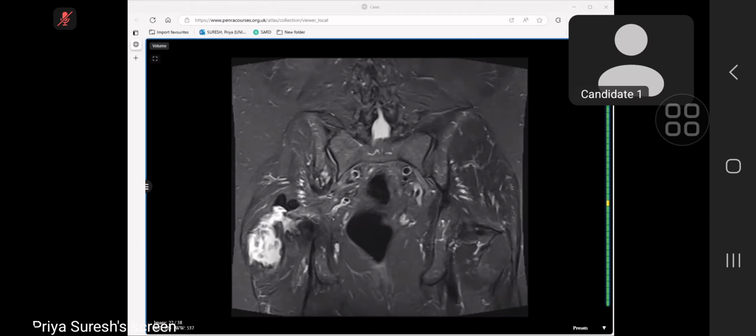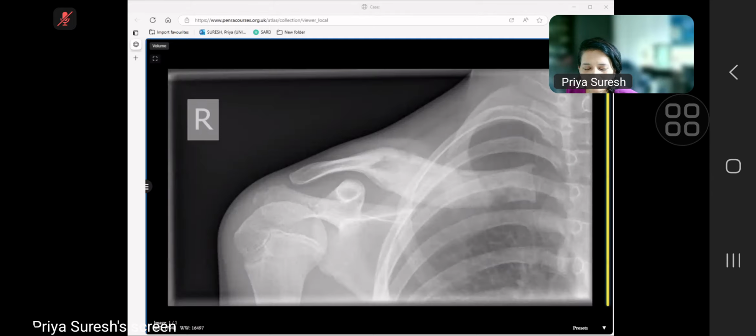And the last one. Okay, this one here. You have acute osteomyelitis, then you have chronic changes, like you described the involucrum and the sequestrum. But this is not that kind of osteomyelitis. It's what we call CRMO, chronic recurrent multifocal. It's called a kind of osteomyelitis, but it is an inflammatory, chronic response. So if you do a biopsy, you will never grow bugs in this. Multifocal, so there can be multiple sites as well.